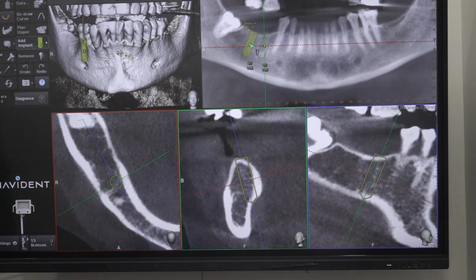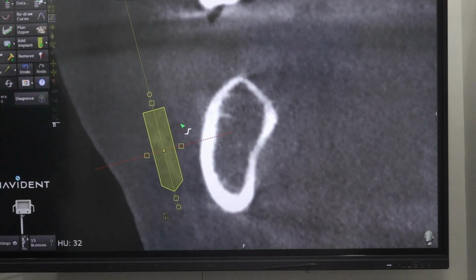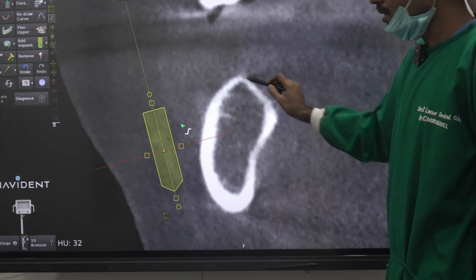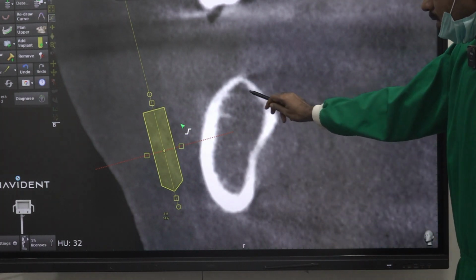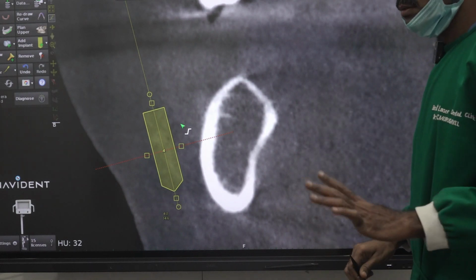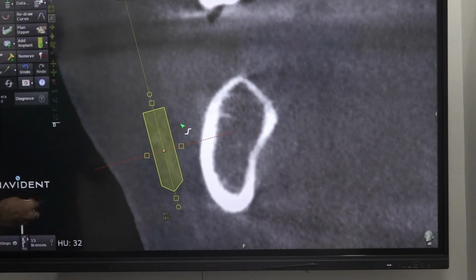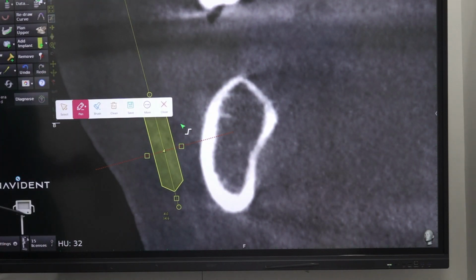Another implant, distal. What is the situation here? Here you can see the crestal cortical is much thinner, and it is fully radiolucent. Whenever you see this kind of complete radiolucency, that means the vitamin D is gone. Invariably they will have a vitamin D level less than 10, 6, 8, something like that.